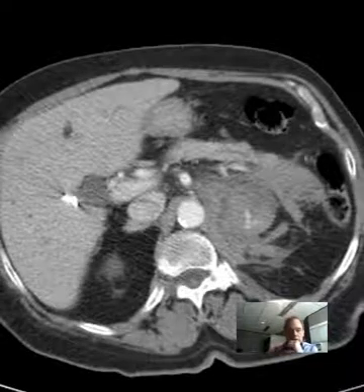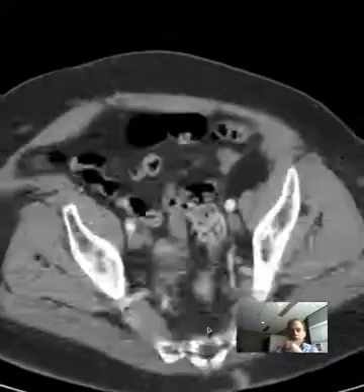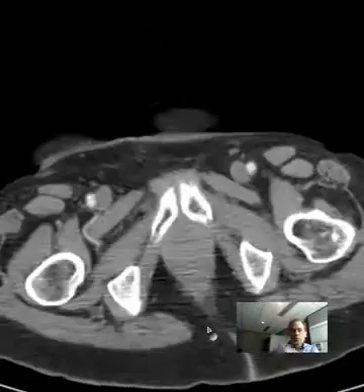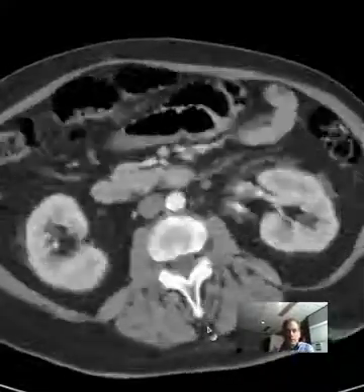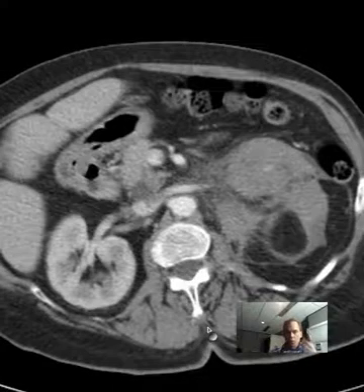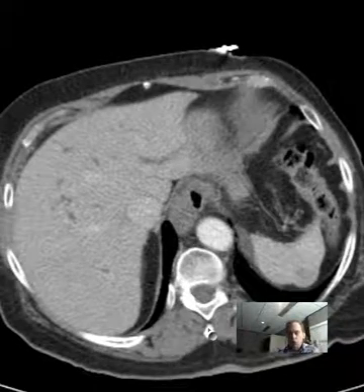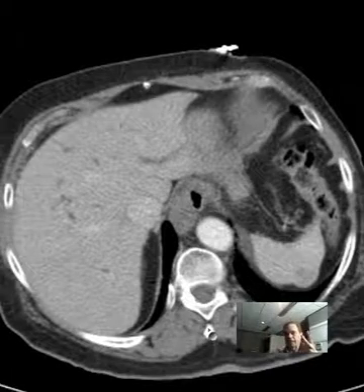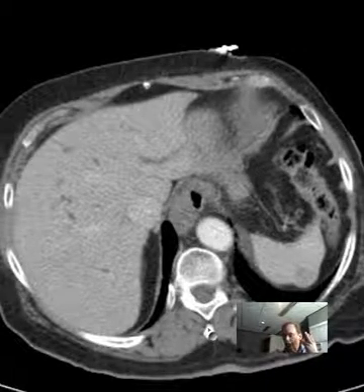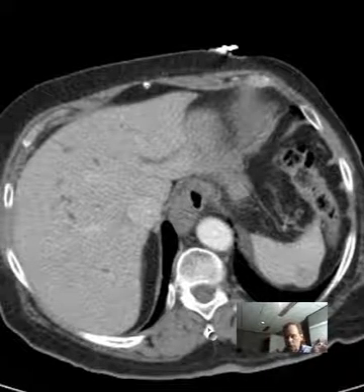Okay, now here we have a nice IV contrast enhanced study, CT Abdomen and Pelvis. Okay, there's your overview. So, 3 questions. 1, is there an abnormality? Yes. 2, describe the anatomy including its anatomic relationships. And 3, posit one or a couple possible diagnoses.